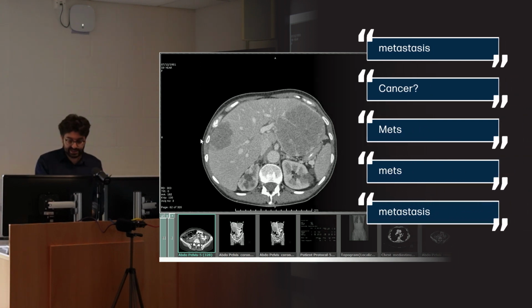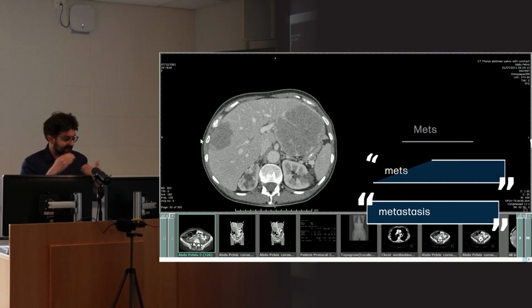Absolutely right, metastases. So you can see how these are the thought processes that you go through as a radiologist. You're looking at the lungs. Oh, there's some funny things in the lungs. You look at the liver. Those don't look like cysts. They look like soft tissue lumps. And there are lots of them. And already your brain is thinking Mets.